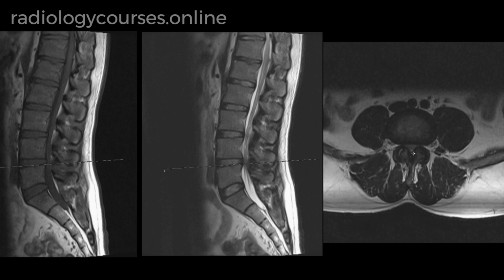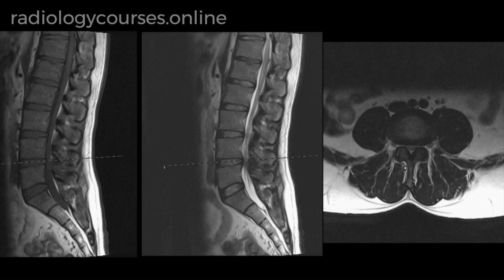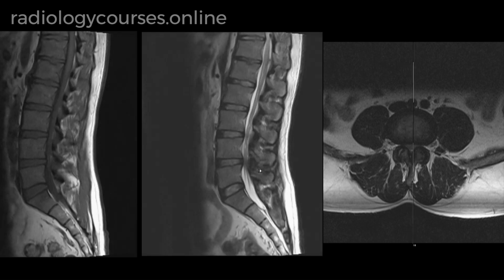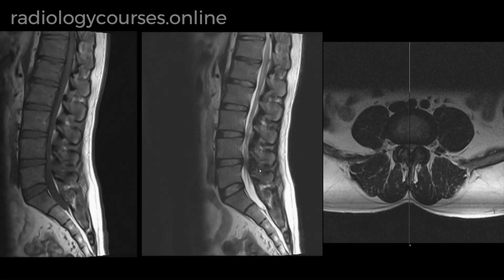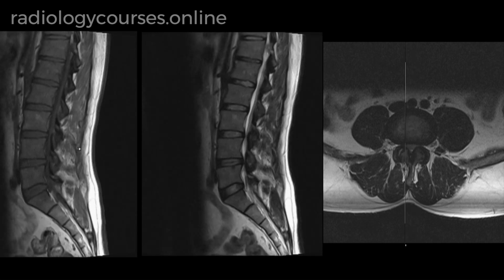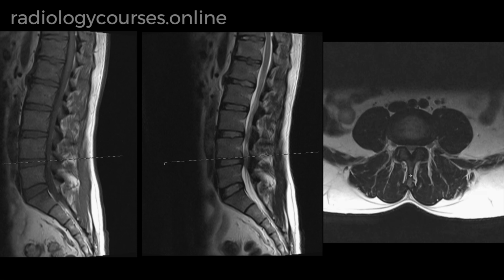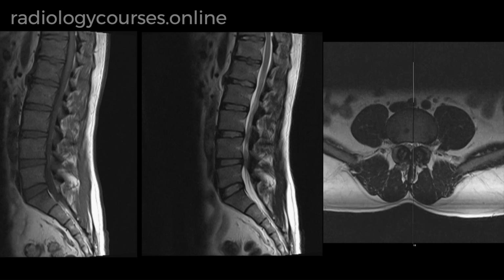This is secondary predominantly to moderate facet joint arthritis and ligamentum flavum hypertrophy with mild disc bulge. So this spinal canal problem is secondary to combination of these three elements, and it is important to document that in the report and also raise the suspicion of inflammatory spondyloarthropathy for which a sagittal STIR sequence of the thoracolumbar spine and MRI of the sacroiliac joint is recommended.